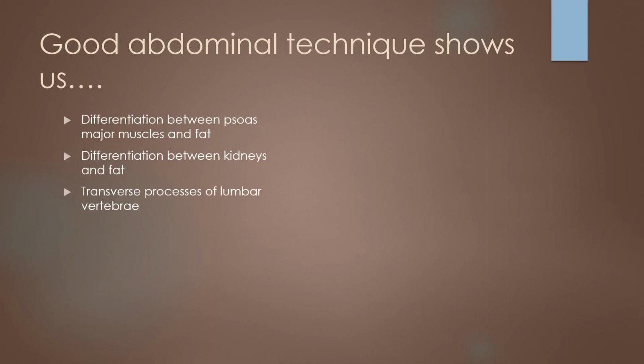Okay, a good abdominal technique shows. So what are we looking for here, and how do we know if this grayscale is good or bad? Is this penetration good or bad? What we really want to see is good differentiation between the psoas major muscle and fat.